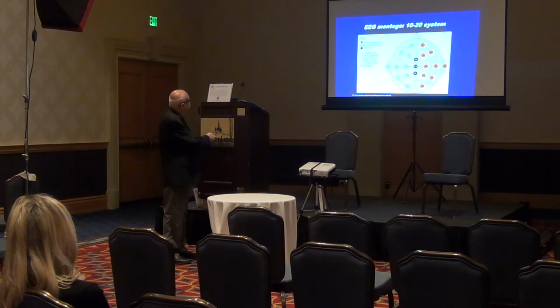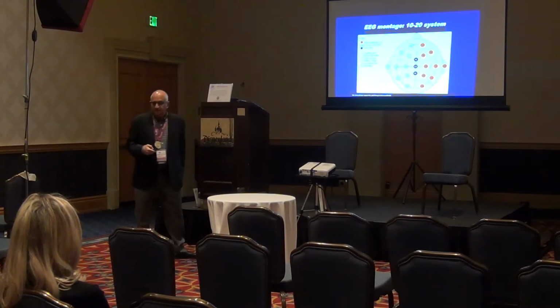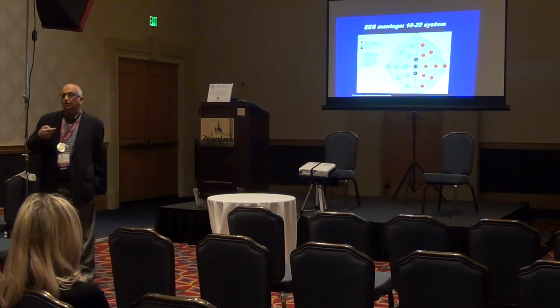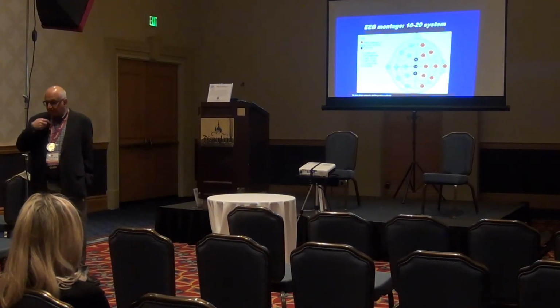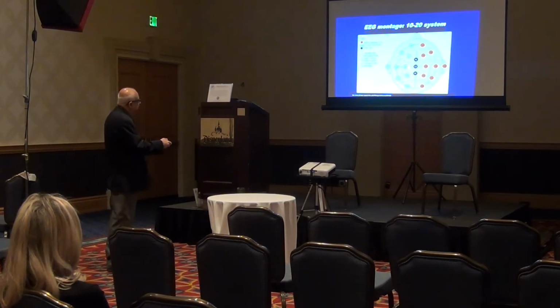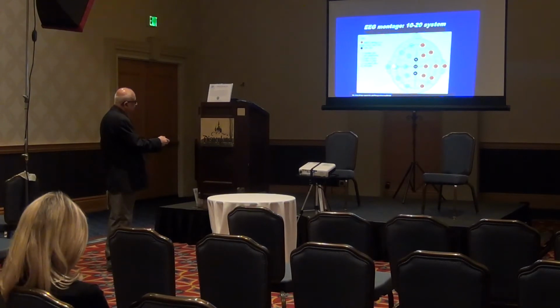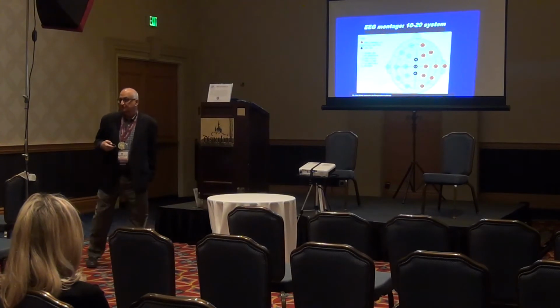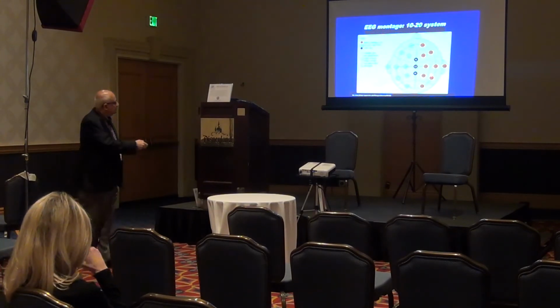I'm sorry the projection is not bigger, but let me walk you through some. See, it says here FP1. That's left side of the head. FP stands for frontal polar. Right? It's the frontal pole. If you look here, it says F3, C3 meaning central, P3 is parietal, O1, over here is T3, mid-temporal, T5 is what we call posterior, back of the temporal lobe.